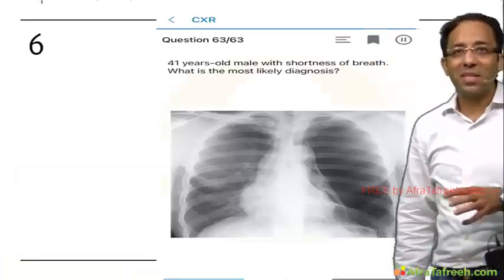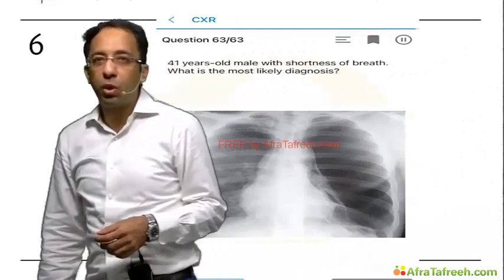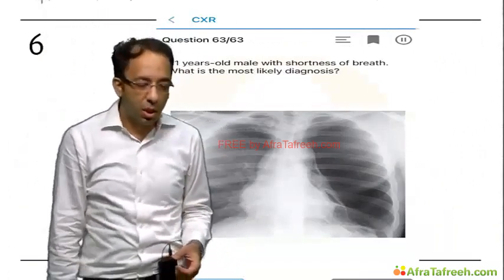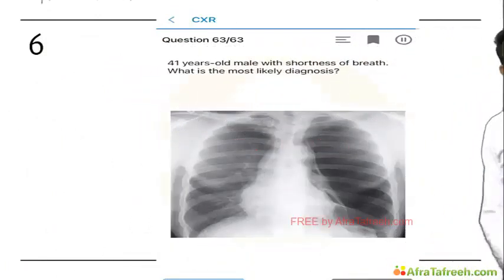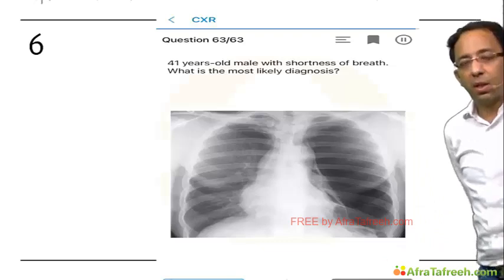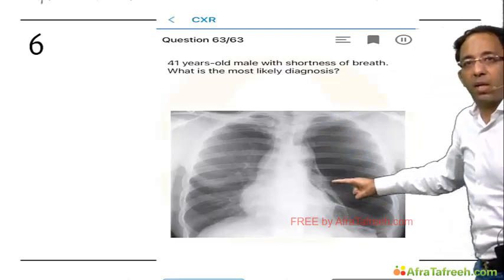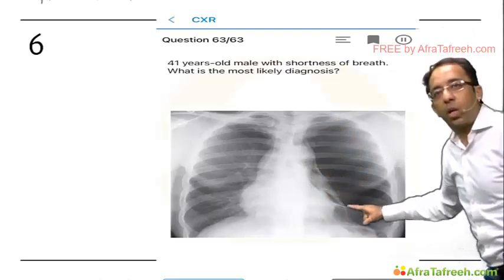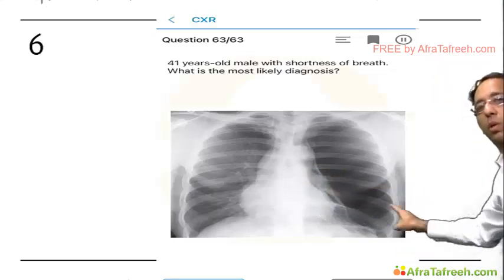This is the toughest question of the DQB. It is there in one of my YouTube videos also. This exact question was once asked in the JIPMER exam. A 41-year-old man with some shortness of breath. What do you think is the problem? The problem in this question is it looks like a pneumothorax, but if you look at this collapsed part, the outer border is not smooth and it is not following the chest wall contour.